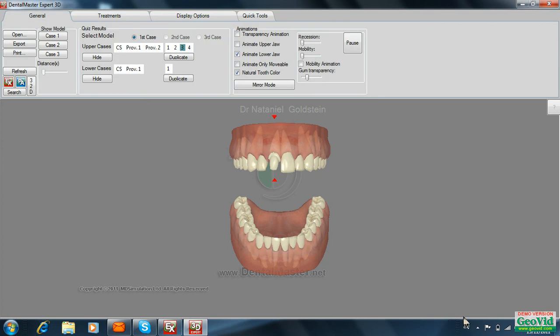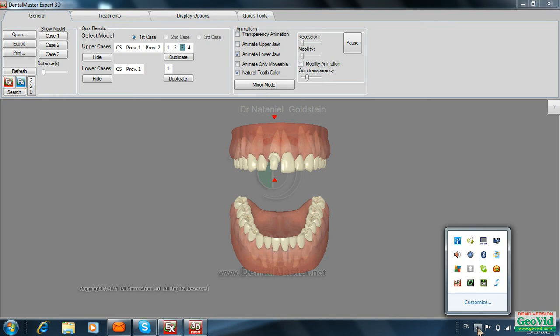This was a very short introduction into the basic functions of the Dentalmaster software. We will continue with the next presentation, with the next movie shortly.